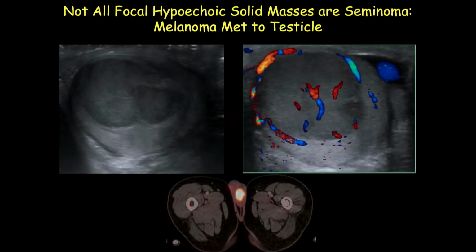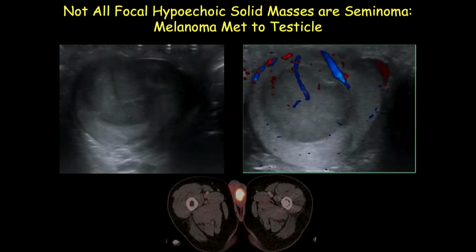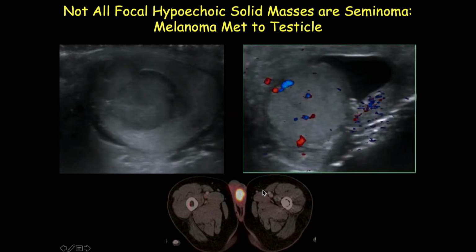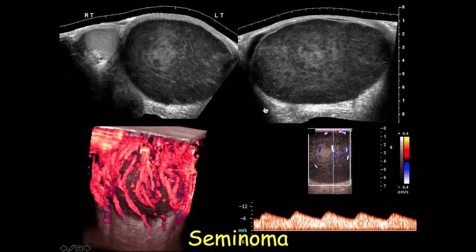And not all focal bumps are seminomas. Here's a rare case of a melanoma metastatic to the testicle. Doesn't happen that often, but you can see the PET scan here. So just everything is clinical context.